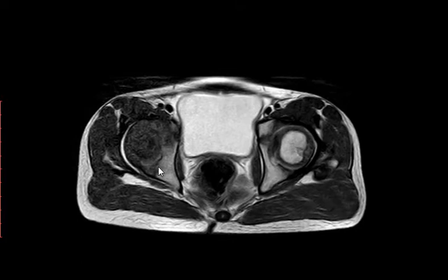Perthes disease, exactly. Usually we diagnose that on X-ray. Here, unfortunately, I don't have the X-ray. And we don't need to do an MRI to diagnose Perthes disease. It's an X-ray diagnosis, but here it was requested for special circumstances. So Perthes disease, the $1 million question: what is the most common presentation of Perthes disease?